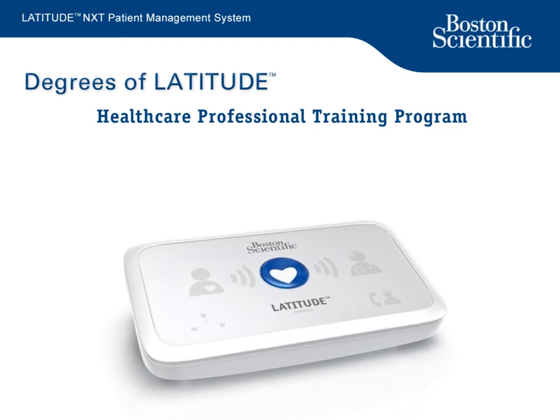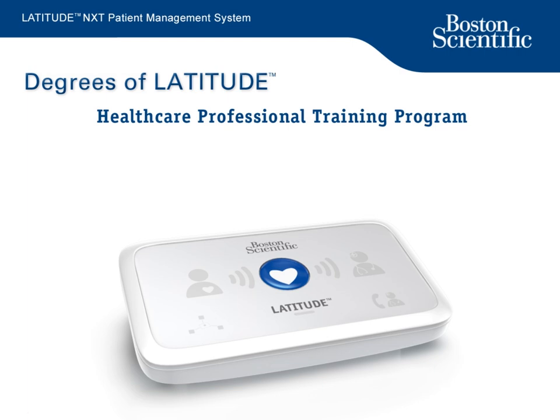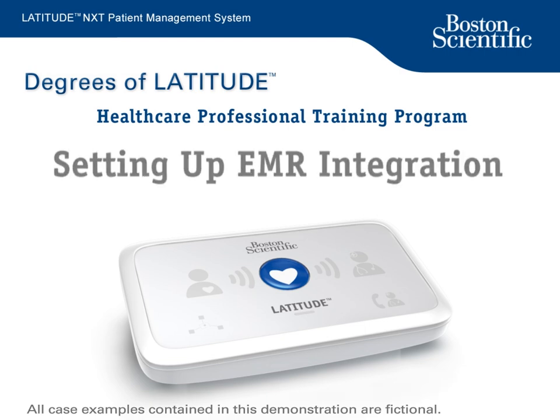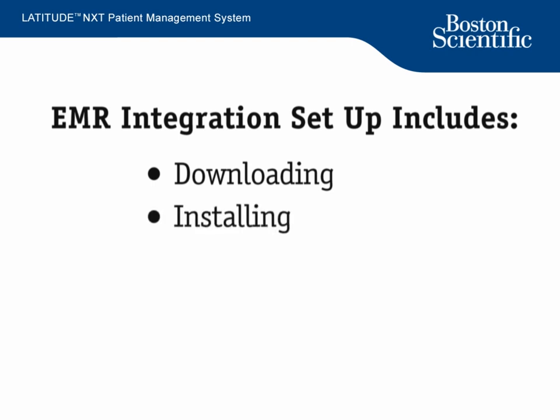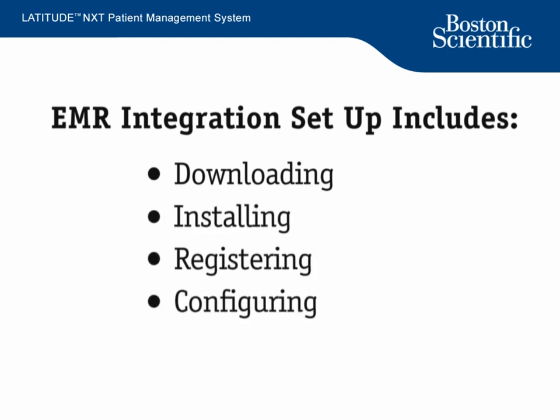The LATITUDE NXT website offers you flexibility and control over how you receive, review, and manage Boston Scientific device and patient data. In this training module, you will learn how to set up the LATITUDE NXT Electronic Medical Record, or EMR, integration software. LATITUDE NXT EMR Integration provides an automated way to export patient device data and reports to your clinic EMR. Configuration of the LATITUDE NXT EMR integration software includes downloading, installing, registering, and configuring the software.